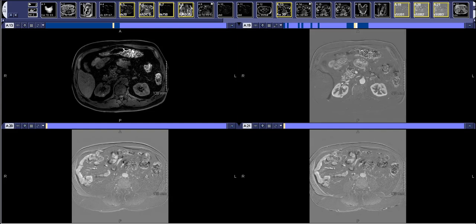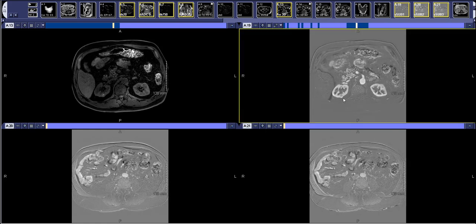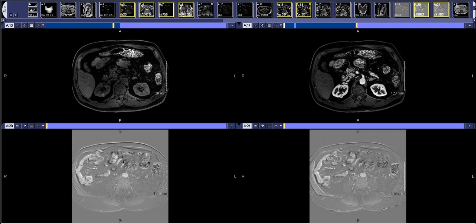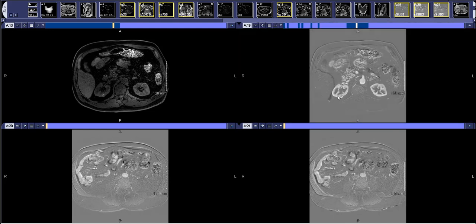These are just calculated sequences where they have subtracted the inherent T1 contrast so that all you're left with is intravenous contrast. And these are really helpful for lesions where, if you look at our non-subtracted image, it's really hard to tell if that lesion is enhancing from the pre-contrast to the post. But once you've subtracted everything out, anything that's left in the lesion that looks bright should only be contrast. The only caveat is that these are pretty sensitive to motion artifacts. So if your study has a lot of motion, I would say that the subtractions may not be accurate.